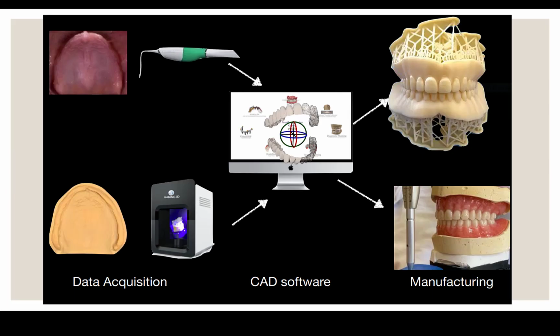By now, you have seen that the software accepts both scans from tabletop scanners as well as optical wands. The virtual articulator takes over and your prosthesis can be designed. Teeth position is initially established, followed by gingival sculpting. The design is now ready to be converted into an STL or brought into other modules within PDC. This is the basic workflow.